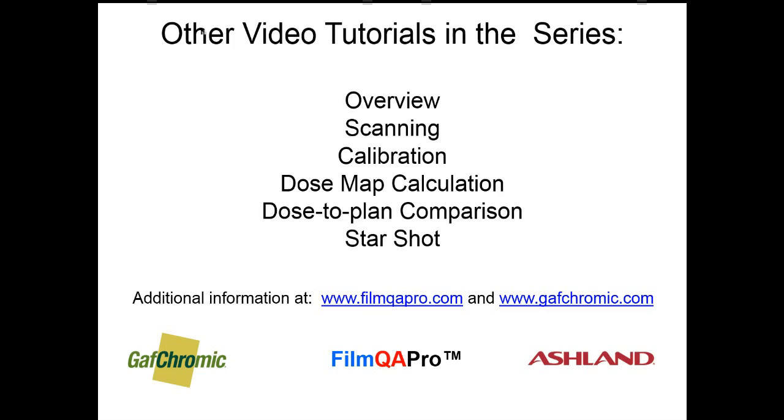That finishes the dose map tutorial. The next module explains dose-to-plan comparison, where the dose map and treatment plan are overlaid and analyzed.